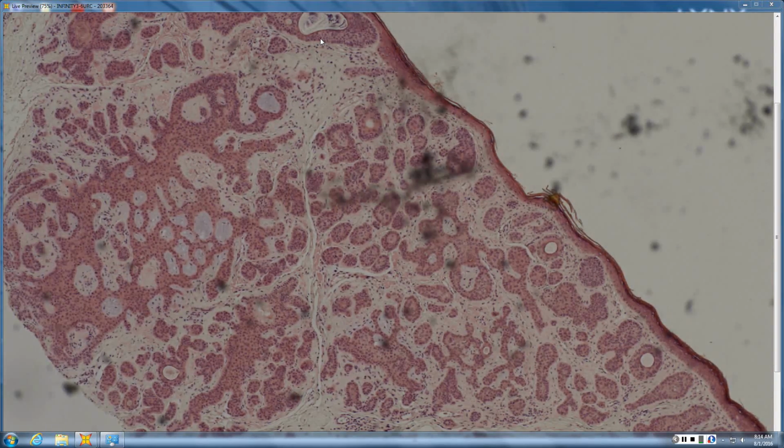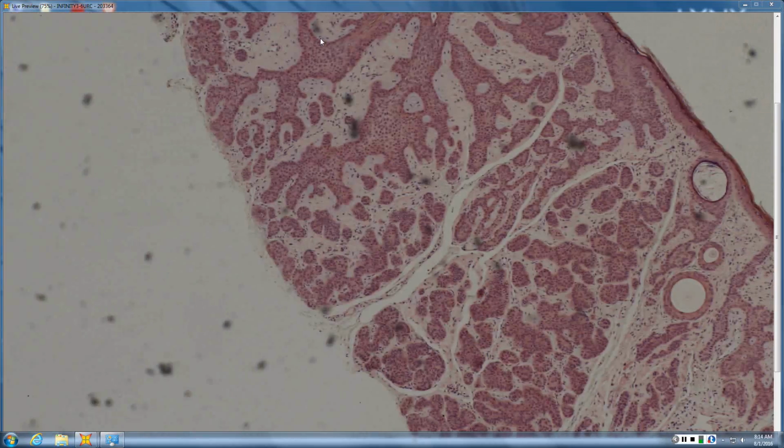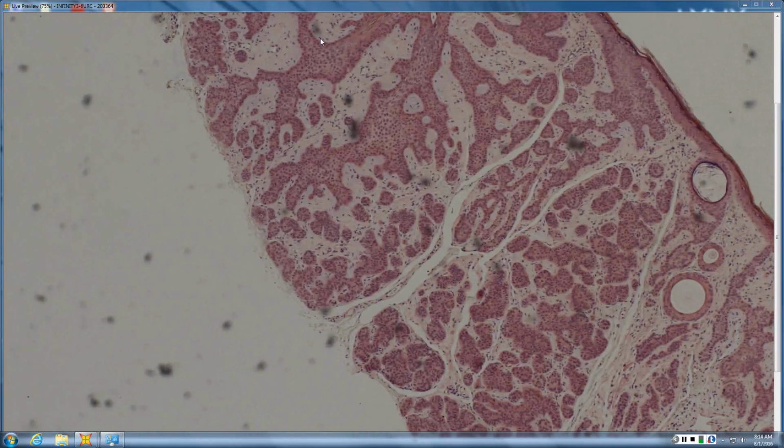And the ones that are pink are the Pinkus and the infundibulocystic that are pink strands, blue buds, and sometimes you don't have the blue buds, and yet you have to recognize it because it's going to behave like a basal cell. So pink strands, horn cysts, radiating outward from central follicular-like structures is infundibulocystic BCC. Good.